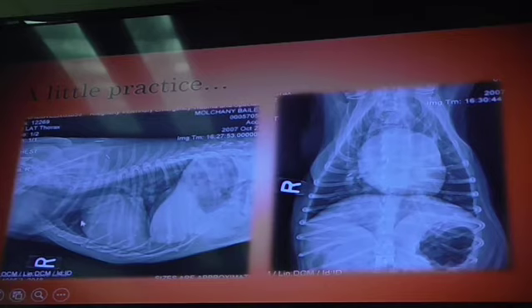That would also support our loss of cranial cardiac waist and have impact on that increased sternal contact. So when we're looking at these, we're not necessarily trying to make a disease fit, but we're going to list all of our findings that we see and see which ones correlate. Which ones are correlating with left-sided enlargement, which ones are correlating with right-sided enlargement.